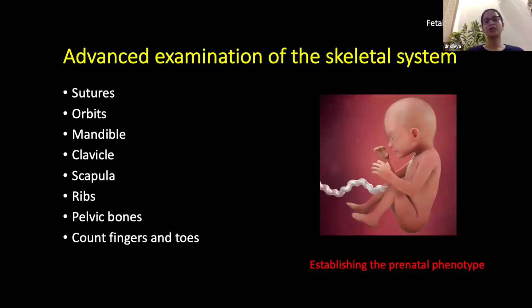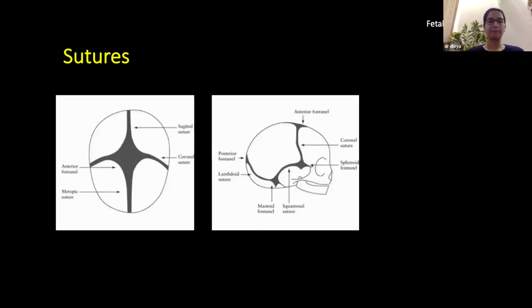And this information is very important for the geneticist and the lab if they are to give us an accurate genetic diagnosis. Not only ultrasound, but of course, postnatal examination has a vital role to play in elucidating the complete prenatal phenotype in skeletal dysplasia.